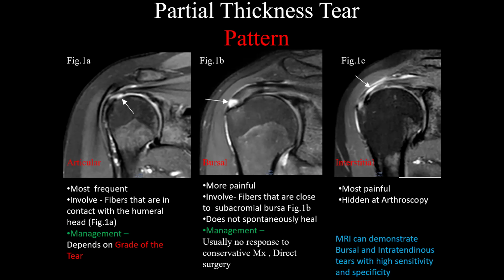Figure 1B shows involvement of the fibers close to the bursal side. These are more painful and do not show spontaneous healing. So surgery is seen as the mainstay of treatment for these tears.